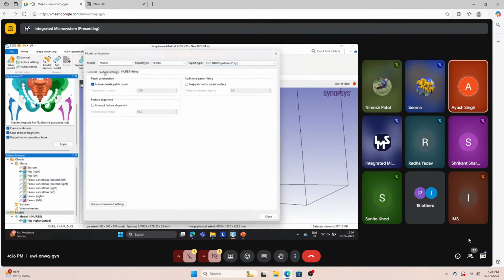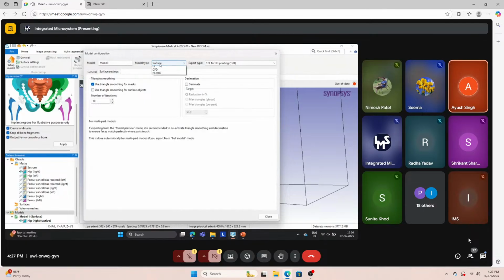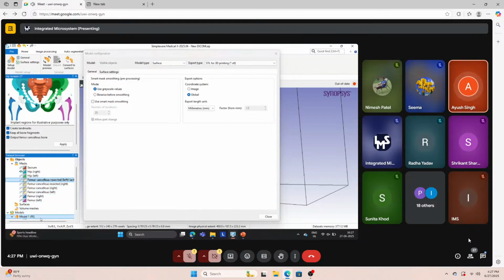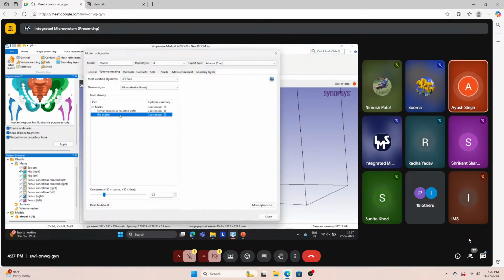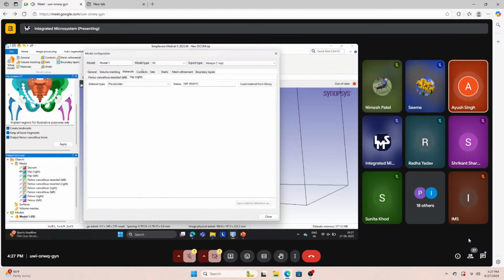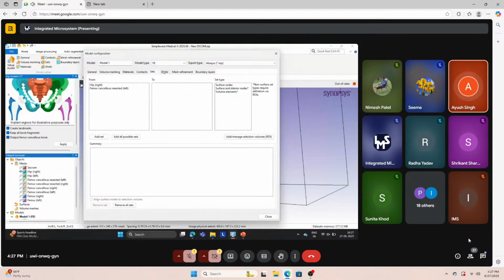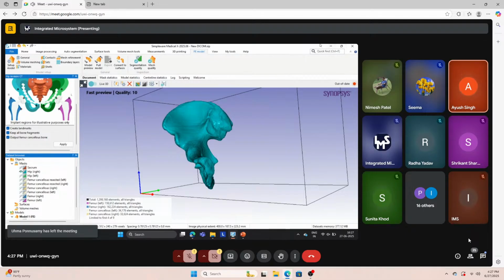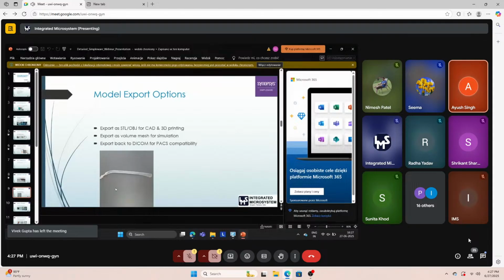And coming to the modeling, a wide range of parameters can be varied. We can set the coarseness level and fineness level individually, corresponding to each and every mask. So if we require a coarser mesh for some region and a finer mesh for another region, that can be done from here. Similarly, adding any contact points, node points, shared shells, mesh points. These are all tasks to be carried out directly in FE modeling. Now, these were the export model types that we support.